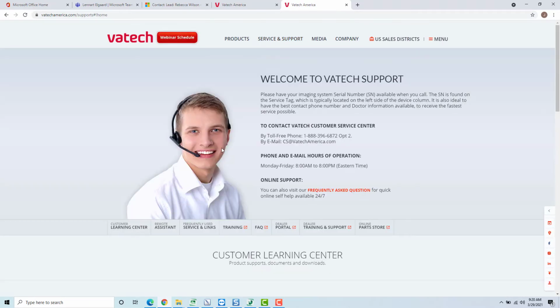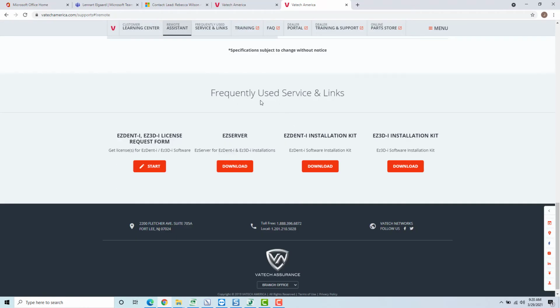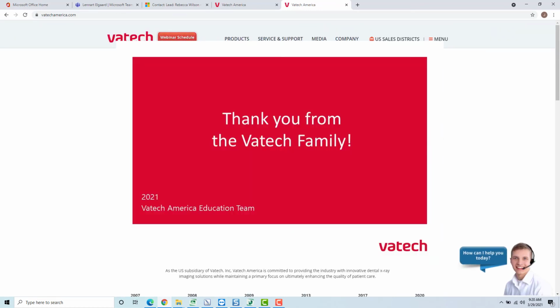Lastly, let's look at anything when you would have to update your software. You can scroll down to the bottom of the page and here's your frequently used service links, installation kits for all of our software for your IT department. Let's go back to our home page.